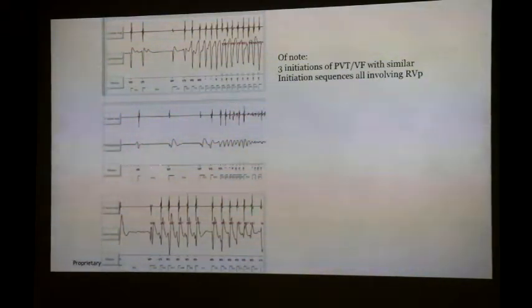Should we consider medical treatment for somebody like that? I can't switch off pacing. I mean, remember, he's pacing 26% of the time, right? So he does have a lot of R waves, but he probably needs pacing, right? Anyway, let's go on and look at it. He's a difficult patient to manage.